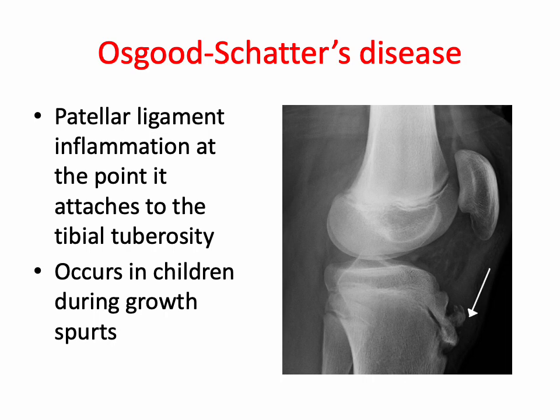Radiographs usually show soft tissue swelling and loss of the sharp margins of the patellar tendon in the acute phase, but it's important there's a compatible history in making the diagnosis. There can be later down the line bony fragmentation of the tibial tuberosity, but you can't equate isolated fragmentation of the apophysis with Osgood-Schlatter's, as there are multiple secondary ossification centres that could be around the same area. So the clinical history is important.